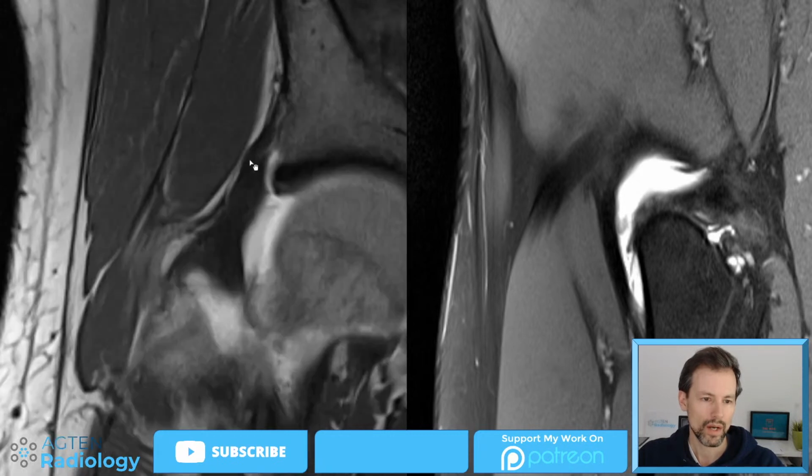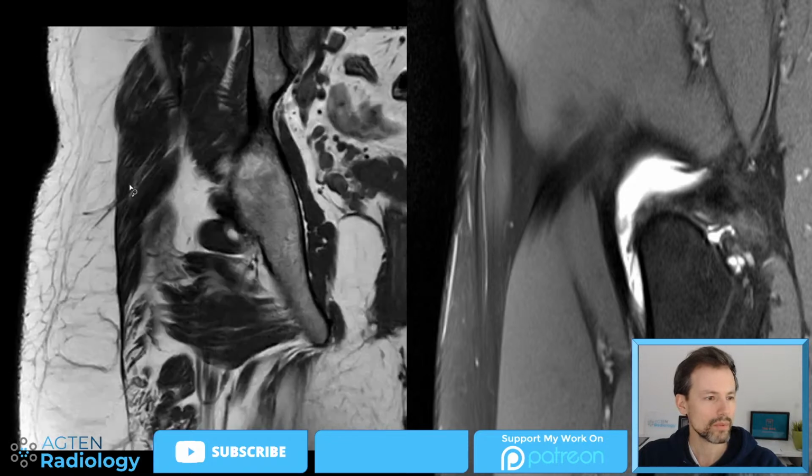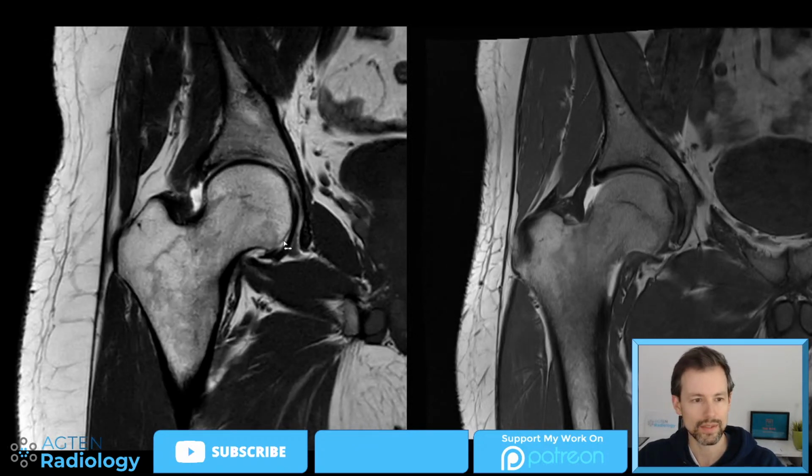And we will now try in the post-operative MRI to see where there is a large scar tissue. So basically, let's see. This is now the post-operative MR. And I will put the pre-operative MR next to it so we have a better comparison, for example, like this. So pre-operative, post-operative.